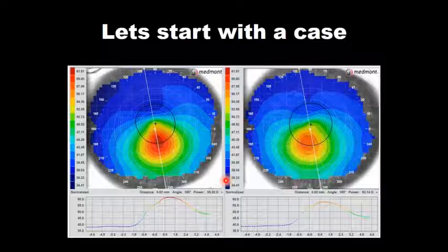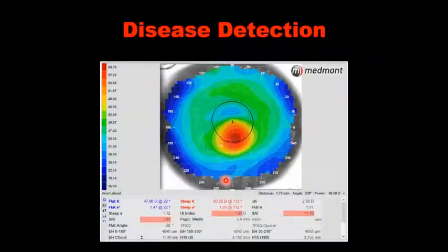So it would be unlikely that a soft lens would be able to manage this type of irregularity within the pupil. The topography gives us some relatively simple information that takes us well beyond what a keratometer would give us, to help direct us in the right direction.